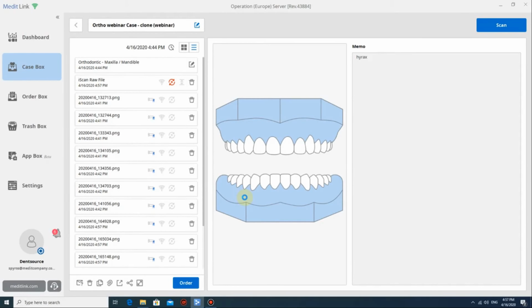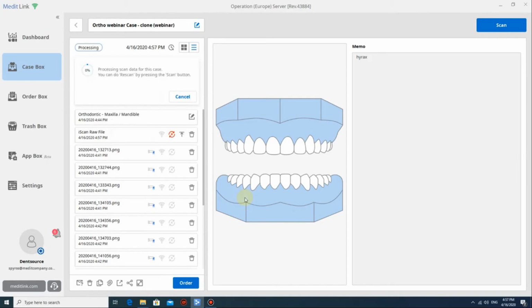and of course, in the options of the export that I will show you, you have the possibility to export exactly with the same coordinates of the CAD software that you're going to work. So, in case you would like to export your case, for example, inside the export options, as you will see here, when the post-processing will finish, you will be able to see the options that I am talking about.